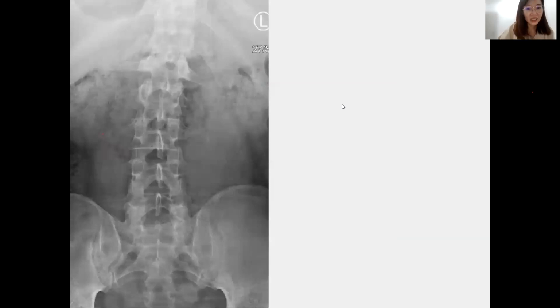What about this case? These are quite subtle. This is also the review area I mentioned just now for abdomen X-ray. Anyone? It's getting harder, I feel. Easy, this one. If you sit further back a bit, then you can see. This one I already coned the X-ray, an easy target.